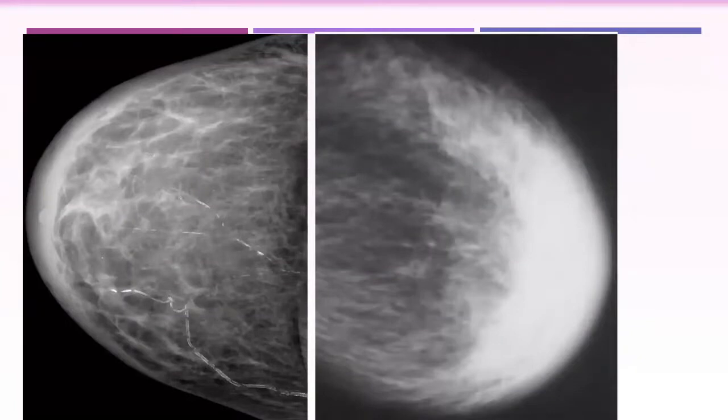Okay. Now the floor is for Hind, I think. Hind or Suhair, I don't know. Who's the one? I don't know. Okay, can take it. Bilateral CC. No, this is a different patient.